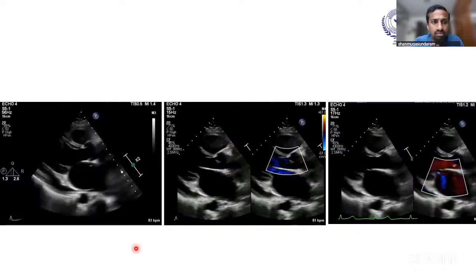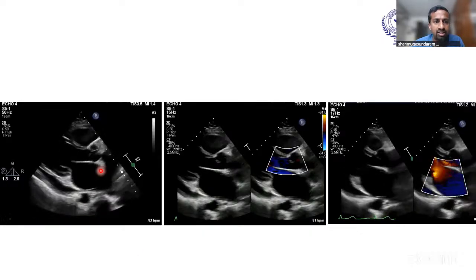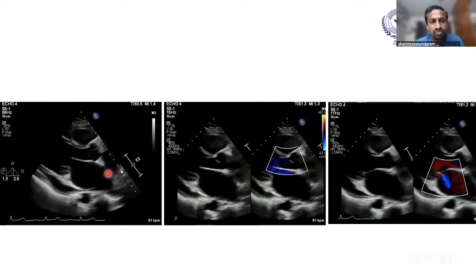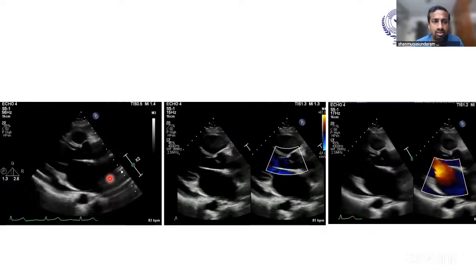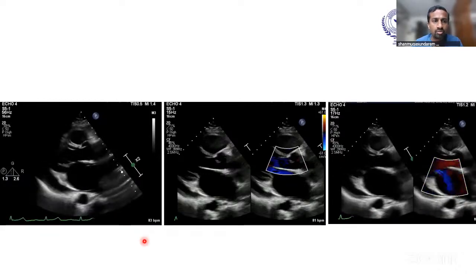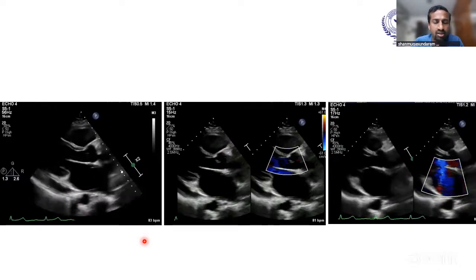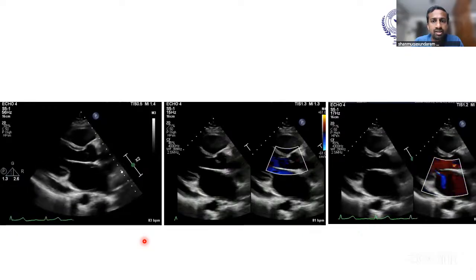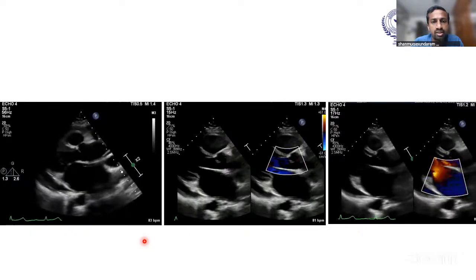So probably if we are careful, we can identify this thickening early, but we are most likely to overlook it as some kind of artifact if it is a mild thickening. So I'm not really sure regarding the magnitude of thickening and whether there is any number. I couldn't really come across any number to suspect atrial endocardial thickening over any other diagnosis.